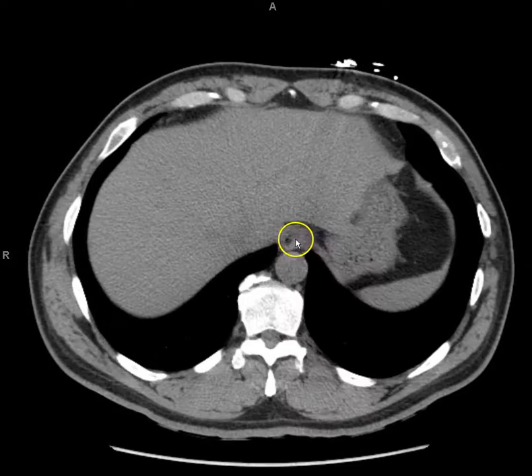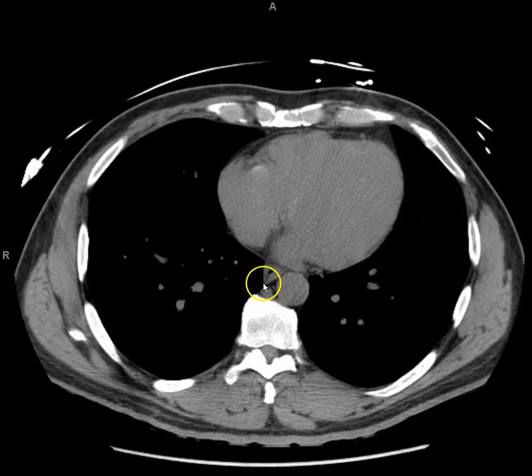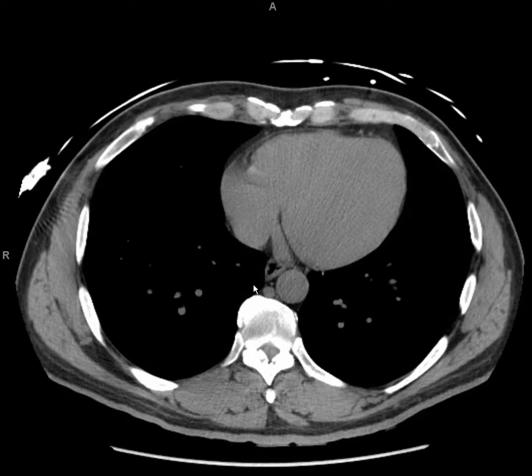And so this is why the very distal part of the esophagus is best approached on the left, the other 2/3 is best approached on the right, and then the cervical esophagus is best approached on the left side of the neck, because the trachea is a little to the right of it. But in the upper thorax, the aorta is to the left of it, and so the esophagus is more to the right of the aorta. It's the same, the best approach surgically. If you need to get to it, yes, surgically.